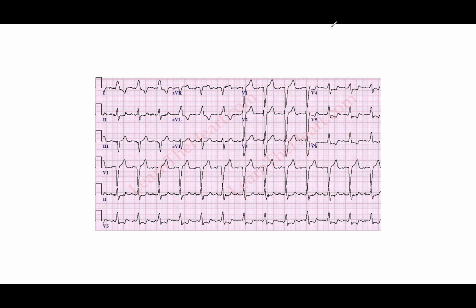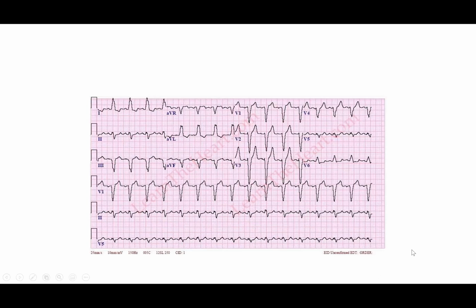All right. So let's do another one. Let's kind of keep going here. There we go. Take a second to look at what we got.